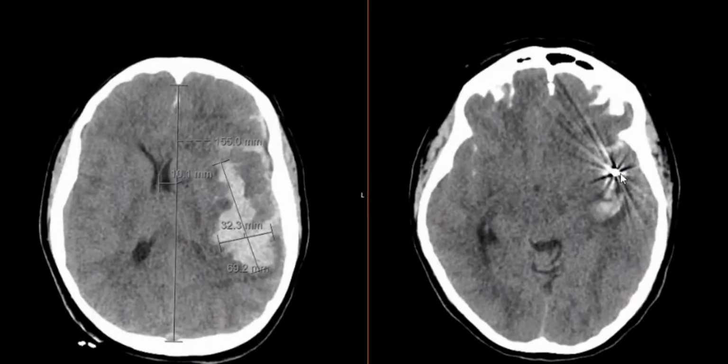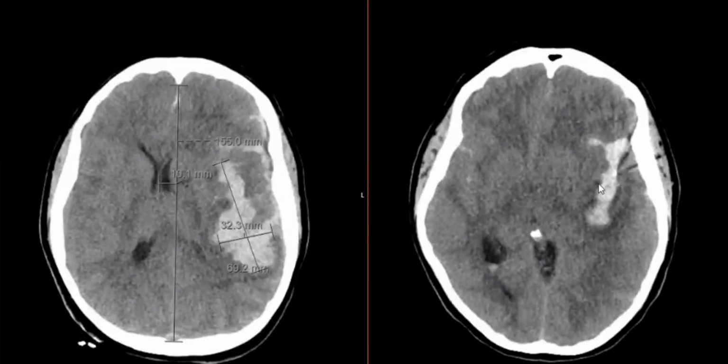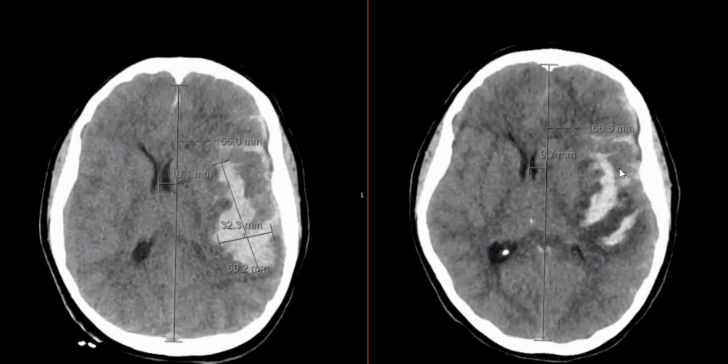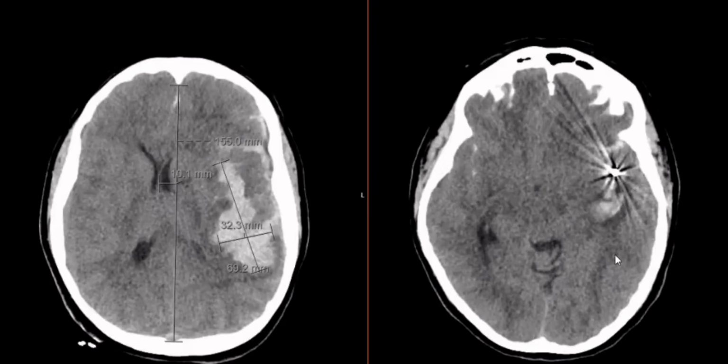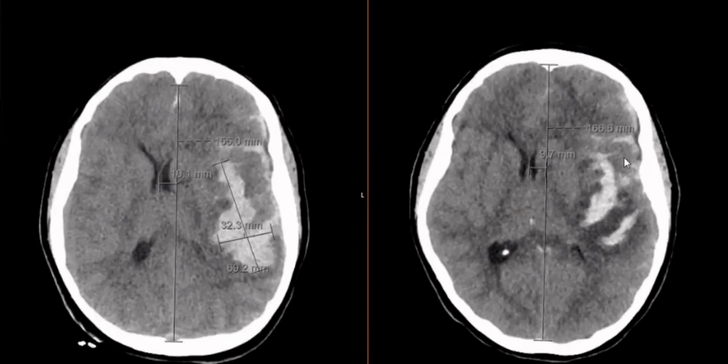There's the coil within where the aneurysm was, and you can see that that's within this big section of blood. That's where it bled from. So what is the cause of the high pressure? The bleed. The bleed is the primary problem, and then the secondary problem is the swelling, edema around that. So in this instance, because it's all within a fixed space, the more stuff you have within a fixed space, the more pressure it exerts.